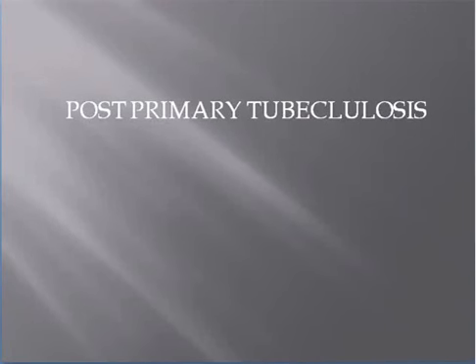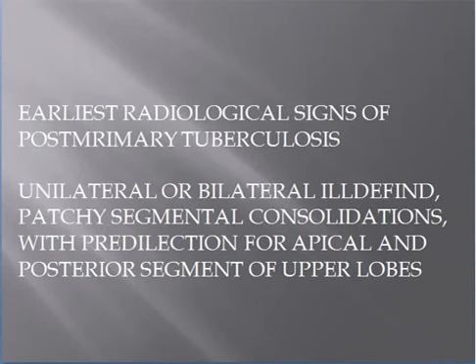Now we come to the post-primary tuberculosis. Earliest radiological signs of post-primary tuberculosis include unilateral or bilateral ill-defined patchy segmental consolidations with predilection for the apical and the posterior segments of the upper lobes.